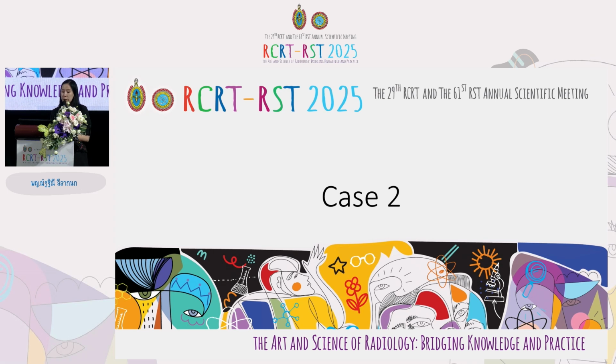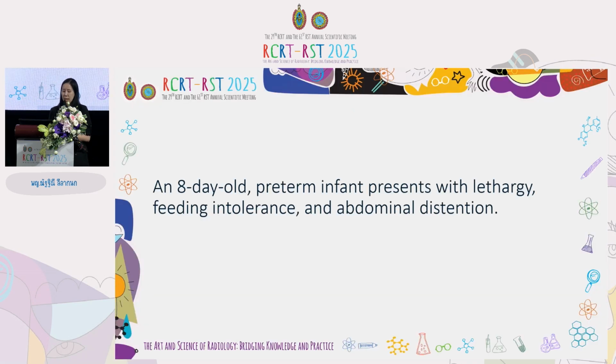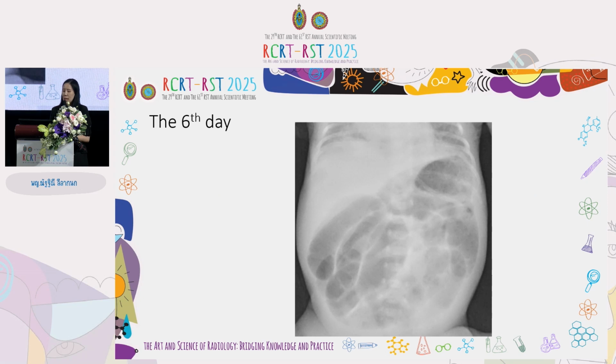So let's move on to the second case. This case is an 8-day-old preterm infant presenting with lethargy, feeding intolerance, and abdominal distension. Her abdominal radiograph on the 6th day after birth shows diffuse air-filled dilatation of multiple bowel loops.